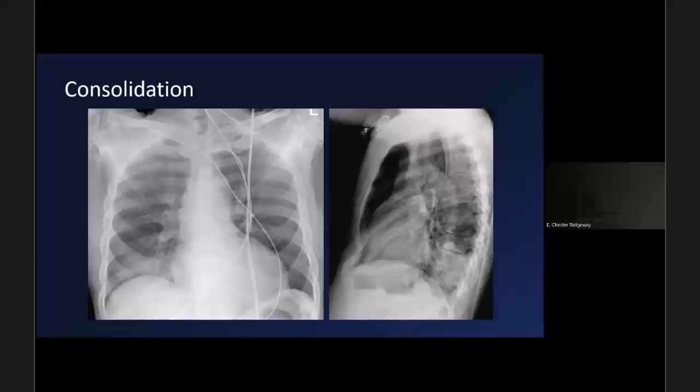And this is where the concept of the lateral spine sign comes in. When we're looking at our lateral views and we're looking at our spine, what we want to see is that the spine is going to be more opaque, more white, brighter, higher up, at the upper thoracic level. That's because you've got tissue overlying it. Again, I'm not an MSK radiologist.